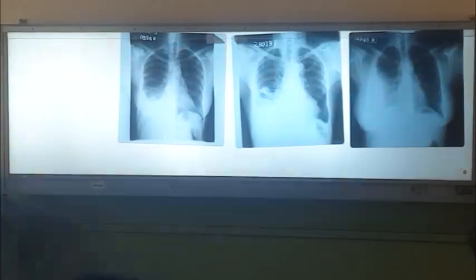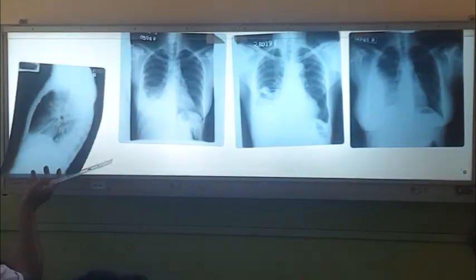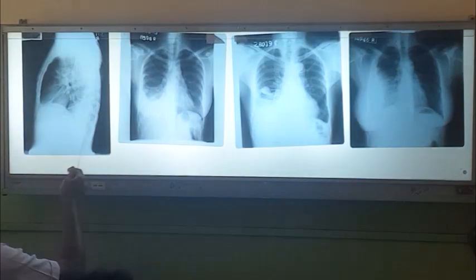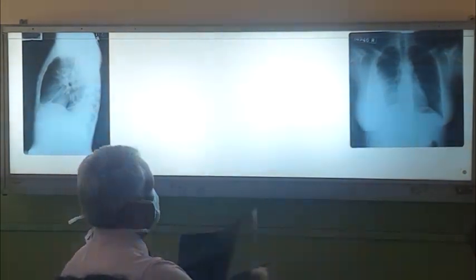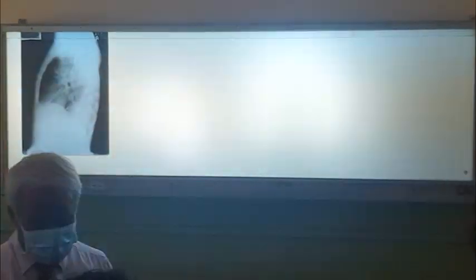Okay. This is a poor quality X-ray. I don't have the PACS you have, but I am keeping this separate. A lot of signs are there, right? So I told you this darkness should be equal to this darkness, so there is no darkness here.